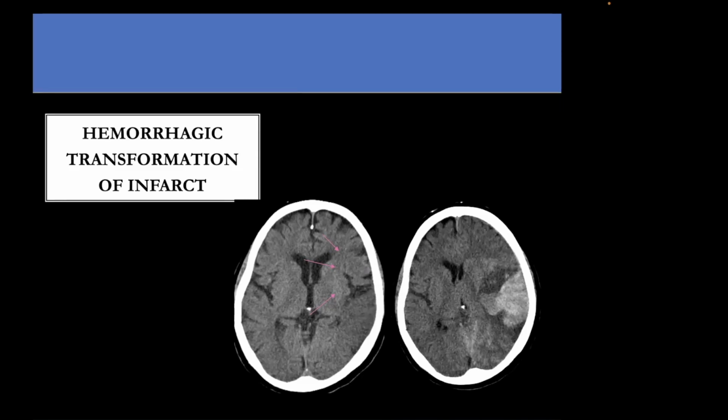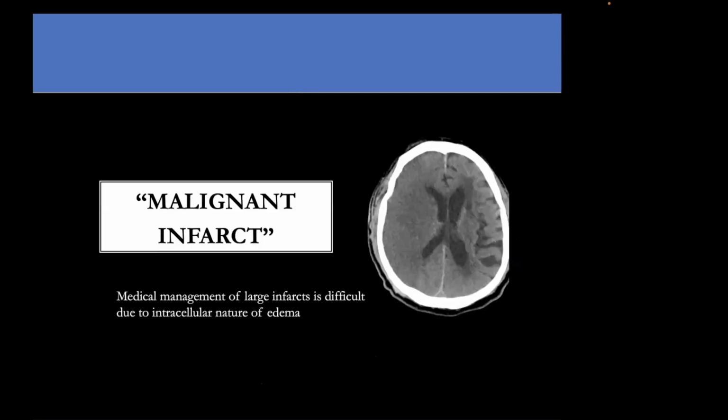So again, these are the concepts and things you should be looking for on the CT, follow-up CT scans in patients, particularly when there's an acute decline in neurologic status in the post-infarct phase.